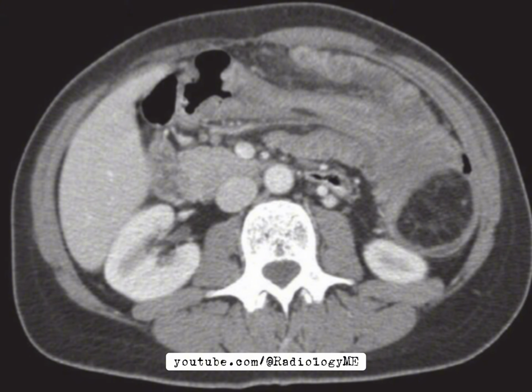In adults, CT is the preferred modality, as it helps us not only confirm the diagnosis, but also evaluate for any complications like bowel ischemia or perforation, and in this case to ensure there's no evidence of malignancy driving the intussusception. In this case, it also helped us visualize the fat within the lesion, pointing toward a lipoma as the likely cause. So the management for this lady would definitely involve a surgical consultation. The intussusception could compromise the blood supply, leading to ischemic or necrotic bowel if left untreated. In benign cases like lipomas, surgical resection is typically performed to prevent recurrence and resolve the obstruction.